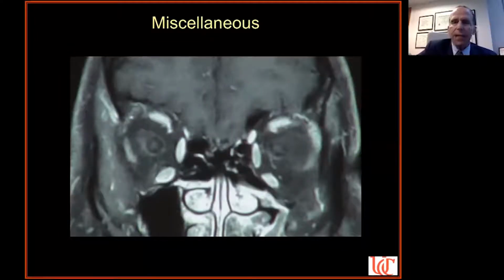And then I think my last image is this, a patient with pain and loss of vision who has some enhancement of the optic nerve sheath, not as prominent over here, who had a condition called optic perineuritis. Perineuritis. No, actually, I take that back. I take that back totally. I think that this is probably just the normal nerve. What I see that isn't normal, and I'm sorry about that, is something else.